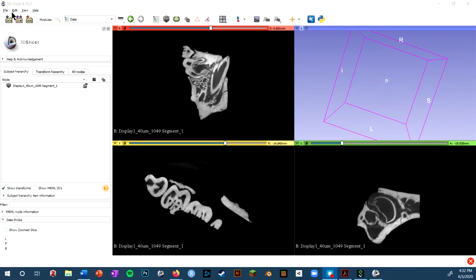First, you'll see this File Edit View menu that you're probably familiar with from other applications. The only part of this menu that you will really need to access on a regular basis that can't be accessed from other parts of Slicer is this Edit Application Preferences. That will allow you to set any application preferences you need to change for better using Slicer.